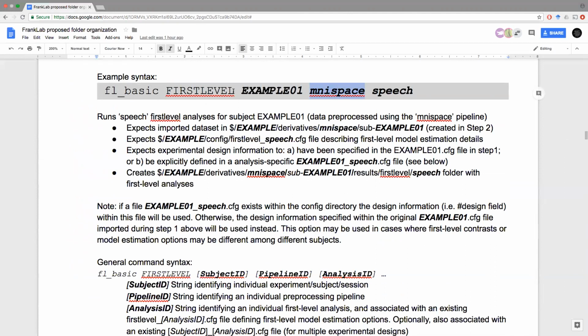These individual scripts will take into account that your data is surface data instead of volume data, and they will adapt the type of plots that they generate and the type of analysis that they are running.